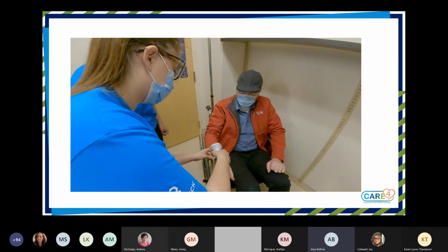TAR is utilized to document and edit all documentation related to blood products and blood transfusions. TAR is accessed via PCS, EDM, and SIR, and designed to enable online charting of blood transfusions from any patient location in real time. As a result, the most current transfusion data is posted to blood bank, your BBK, and to your electronic health record, your EMR.